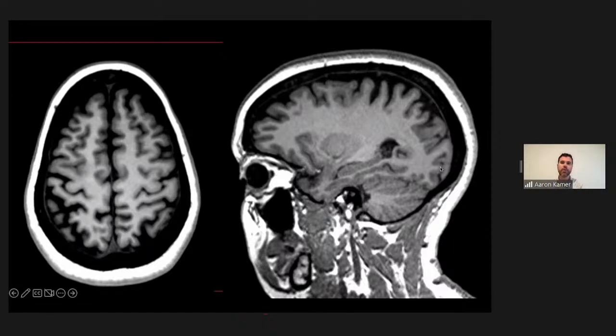I've had this before where a neurologist will say, hey, did you think there was cortical dysplasia on the other side, right over here or something, and I'm like, yeah, it's there. So sometimes once it's pointed out, it's a little bit easier to see, but holy cow, these are difficult. So, all right. Thanks for being my guinea pig, Tony.